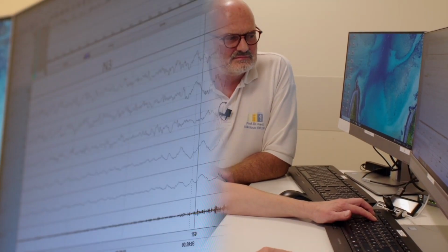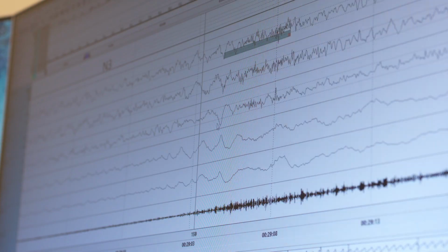It's wonderful. Now we can really step on the gas a little bit. These are the phases we as evaluators prefer because you can really step on the gas. And deep sleep is usually a longer phase. But now we've seen here the first rough one is already here. But we can still sleep soundly now.